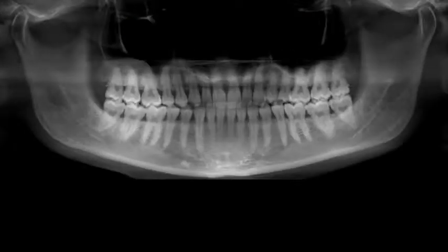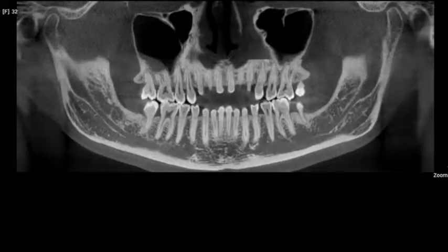So maybe MRI, and there's some literature out there. Now here's the lady, okay? If you look at this, you'll see a panoramic image with nothing going on. She's got her full complement of teeth. She's got a small mucus retention cyst in the right antral space. If you look carefully, some of you up front will see the calculus, but she had no complaints, okay? So what can we do?